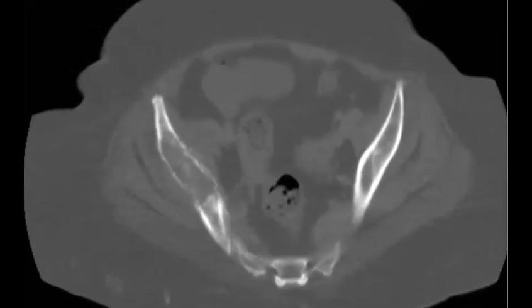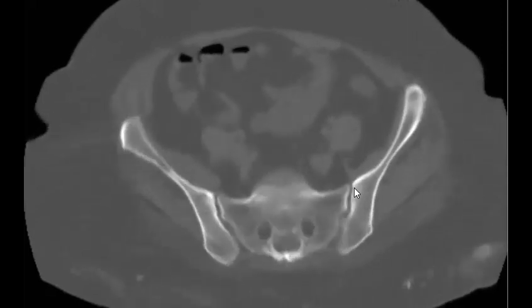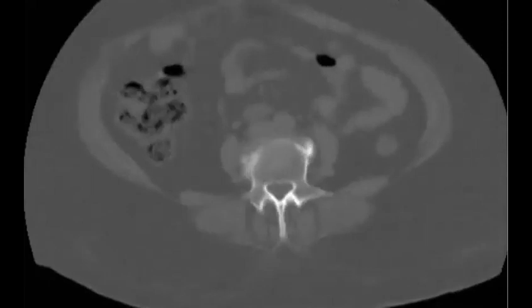I am looking for what you will miss. If you miss something, then you will miss some marks in the exam. Soft tissue component you mentioned, permeative lytic you mentioned. I am waiting. Okay, wide zone of transition, perfect. I am waiting for something. What about the periosteal? Okay, perfect. Nermine, yes. And sorry, iPhone. Yeah, perfect. Nice. Now we describe this, and I will go with you until the end of this exam and come back again with you.